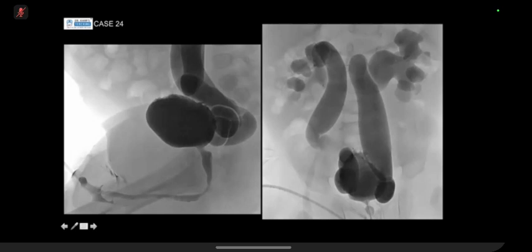I think on here the bladder does look a little bit irregular, and I see what you mean, but I think it's also because it's dynamic and the child is probably passing urine as they're imaging. But when the bladder is nicely distended, there's no obvious trabeculations or diverticula or urethral valves to suggest a distal obstruction.